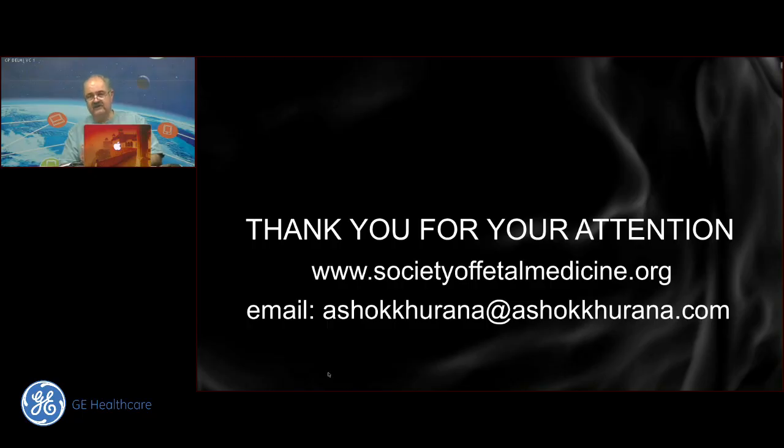But it always remains a differential diagnosis, and very often you're not able to demonstrate this, but the clue lies in being sensitive to the fact that you watch this fetus from morning to afternoon, afternoon to night, and night to next morning, and I didn't get a full urinary bladder, I start thinking of a bladder exstrophy. The rest of the stuff you will do anyway.